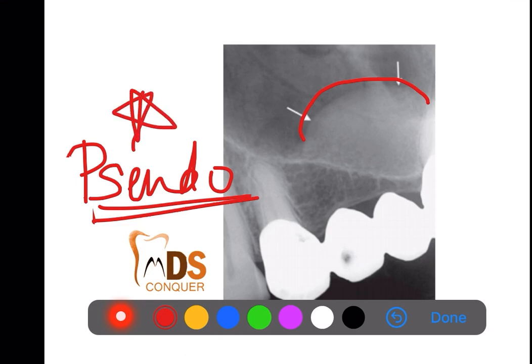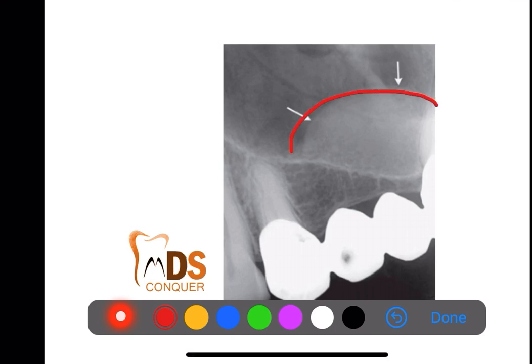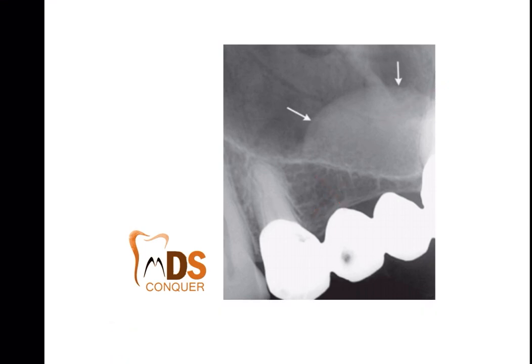What you have to do is localize first. The internal structure is fine, and you can see there is no border that is clearly appreciated, right? And also you have to see the epicenter of the lesion. The epicenter of the lesion says that it is not odontogenic. So you have to go for a cyst or a pseudocyst which has occurred here in the maxillary sinus. Okay.